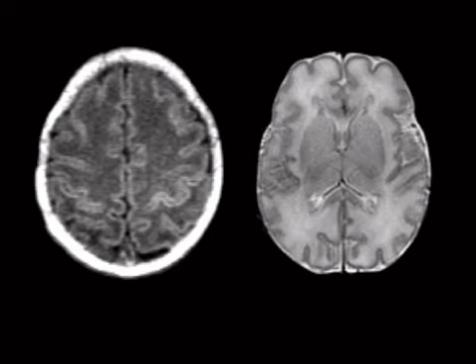Now, the way that you tell the difference is that white matter should be white on T1 and white matter should be dark on T2. But that's in an adult. In a kid, it's different, and it depends on the age of the child. A T1 image is not going to look like an adult image until the patient is 1 year old, and a T2 image is not going to look like an adult image until the kid is 2 years old. So 1 for 1 year, 2 for 2 years. This is actually a T1, and this is a T2. It's the opposite of what you'd expect, where white matter is actually dark on T1 and white matter is actually white on T2.